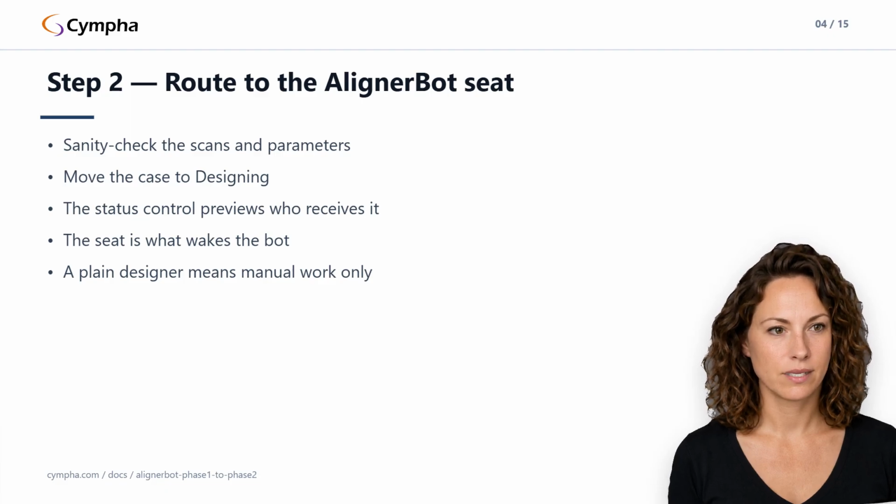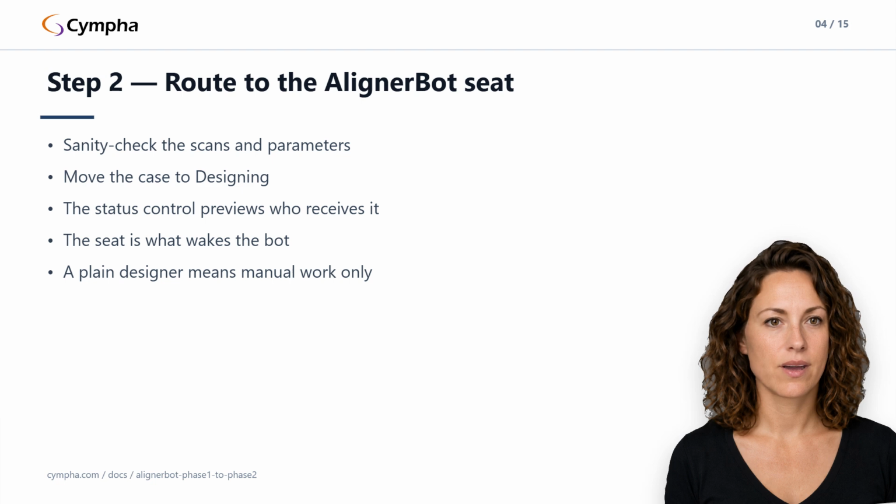If you want the assignment step in its own right, the dialog, the options, the edge cases, that's covered in assign a case to a designer.